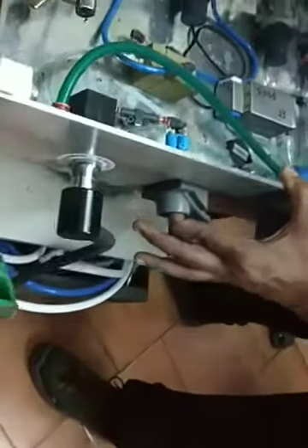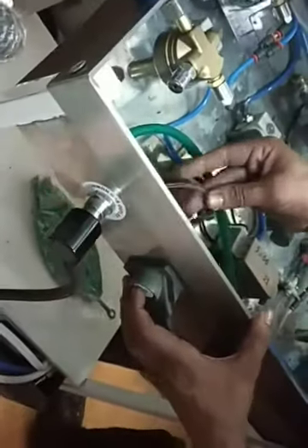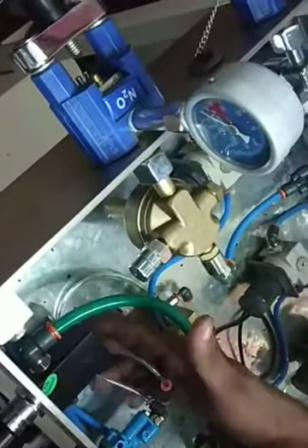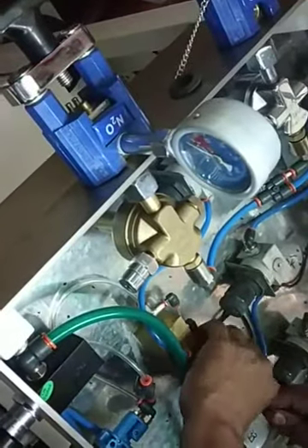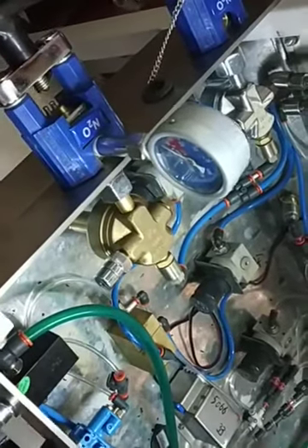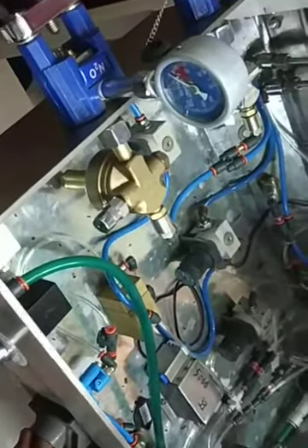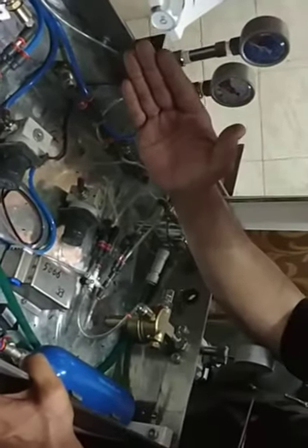So when I press this, the oxygen which is coming over here, what will happen is this oxygen, if you see, this is connected. When I press the oxygen flush valve, the oxygen directly comes. Now this hose is connected to this, and this is connected here to this, and this is connected over here. So when the oxygen flush valve is pressed, this oxygen which was designed to go to the hypoxic alarm and the pressure gauge, and which was on the way to the flow meter, because I press this, gets closed, and automatically it comes over here and refills the refilling bag.